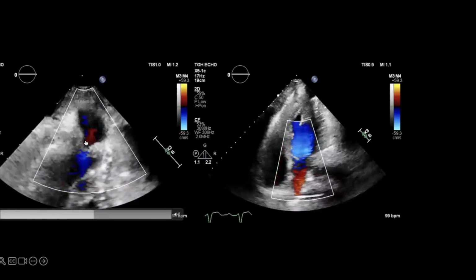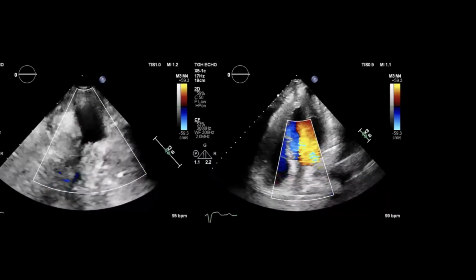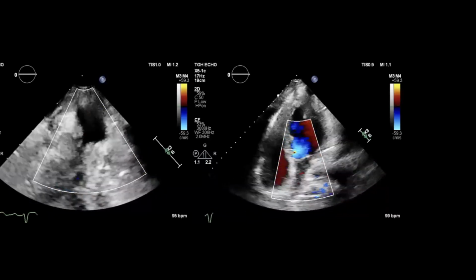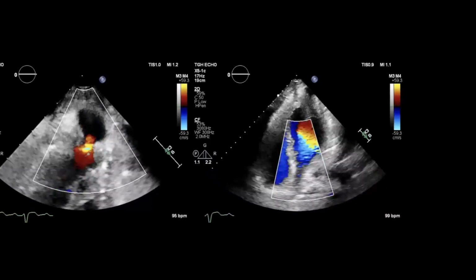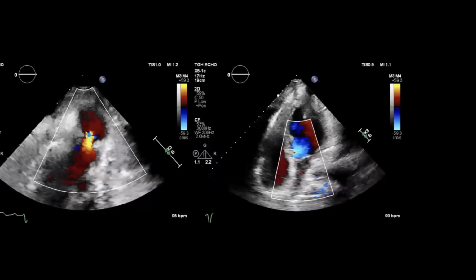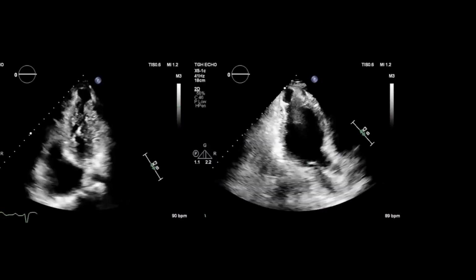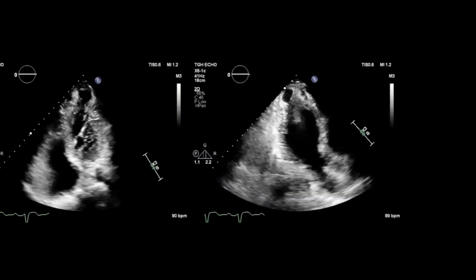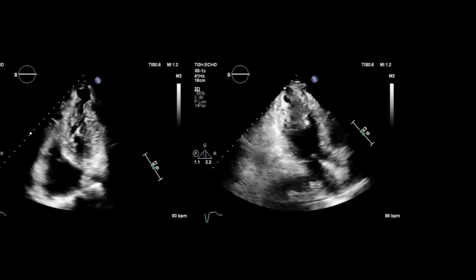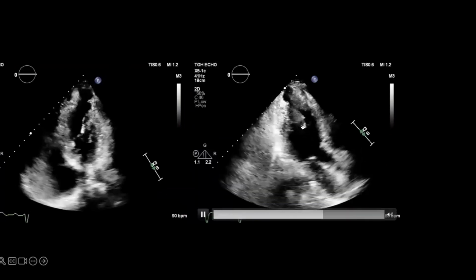Yeah. And the other hint is that you'll see flow into the aneurysm in systole, but there'll be a diastolic flow that comes out after if you do CW. So it's a double Doppler sign. Unfortunately, they didn't really have good Doppler signals on the images I downloaded. Very focal, yeah, with a very narrow neck. What we're seeing, probably on the other images like the four-chamber, this might be just papillary muscle or just.